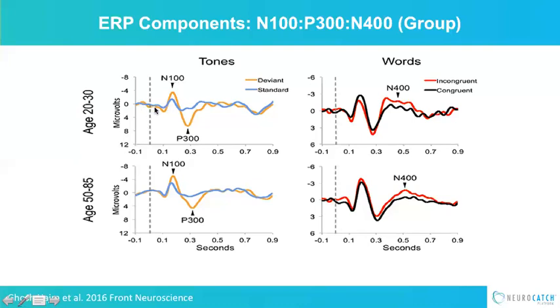So what's important here is this is a very standard waveform shape for your brain processing sensory information. It's called the P1, N1, and P2, P3 complex. And you see the P3 here. I'll tell you more about the P2 later on. But this response is something we see quite commonly at the early stages of sensory processing.